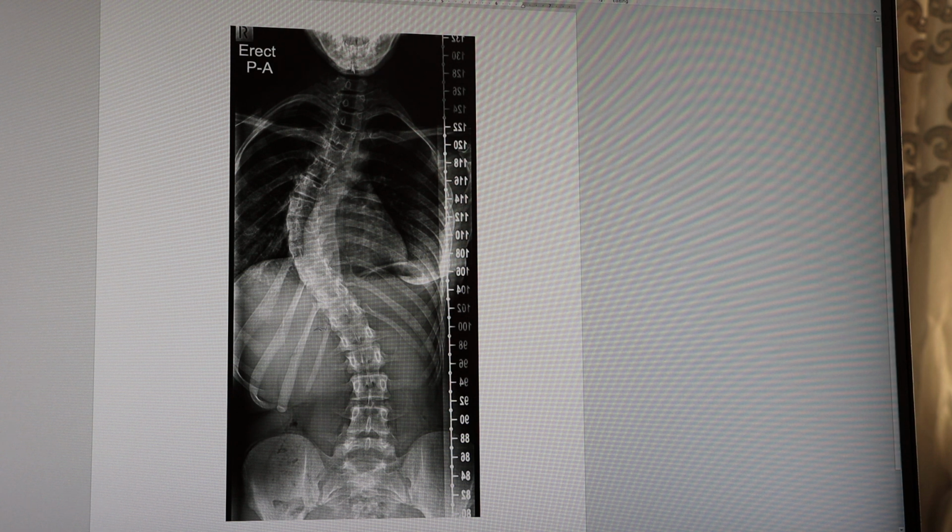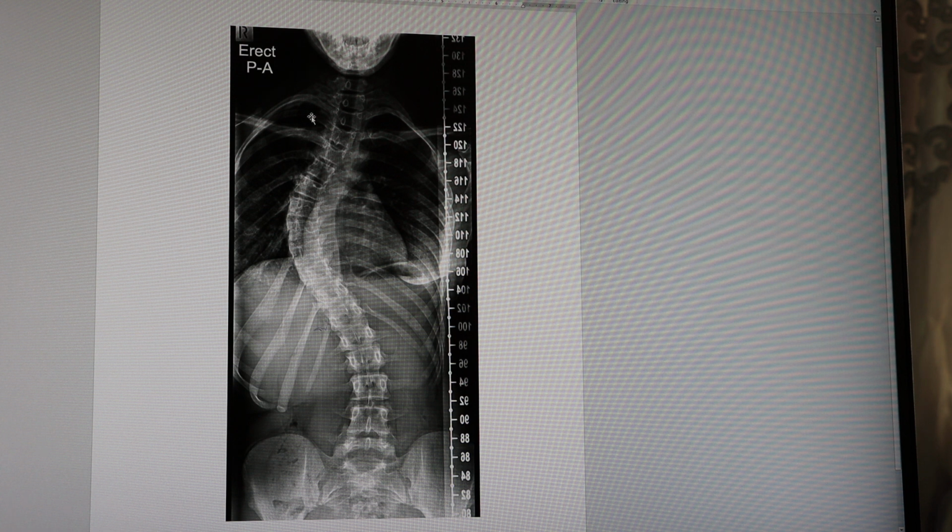Now, in this case, I'm looking at the vertebrae. First of all, looking at the vertebrae and the ribs in general, and then looking at the ribs, they are separated, they are not fused at any level from both sides. Then you will have to count them. As you all know, these are the floating ribs, so you'll be counting them, and yes, they are 12. And on the other side, they are again 12. So some patients have duplicate ribs, others have missing ribs, so you'll have to be looking for these criteria as well.